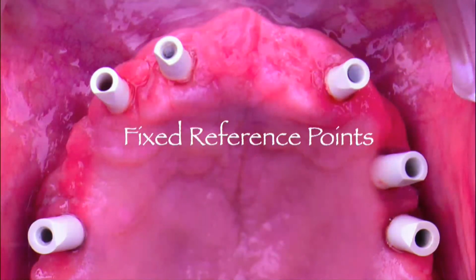Now, I'd like to really focus on the most significant factor, at least to me, which is the absence of fixed references for the completely edentulous. Scanners work great for the partially edentulous because we have fixed references. We have teeth that the scanner can pick up very easily. However, with completely edentulous cases, the only fixed references we have are those scan bodies. The majority is soft tissue, which we know distorts significantly when compared to teeth. And in a sense, this is why we established the altered cast technique to compensate for that distortion.